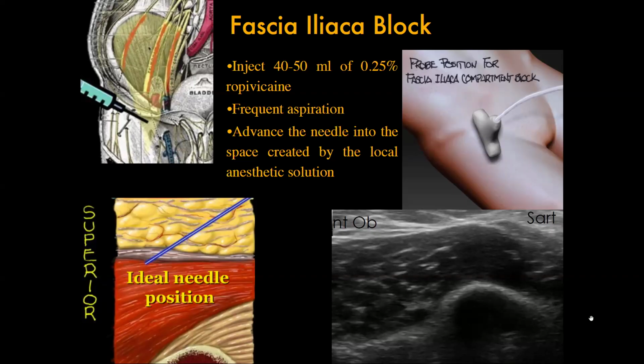The bottom right picture here is showing what they call the bow tie sign. If you look at the hyperechoic, hypoechoic, anechoic, this terminology here. So the hyperechoic ilium, that's the pelvis bone there. And this is a striated muscle on top, the iliacus. And then you have the fascia iliaca over the iliacus muscle. Above that are two muscles, they call this the bow tie sign. You see how this could be considered a bow tie in the bottom right picture.